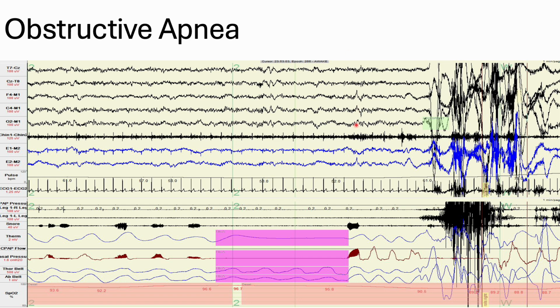I also would have made the arousal more right here because that's when the big breath happens and you have PDR right there. But this was just scored where it kind of looks obvious. The problem with that is not lining up with this, and so this is not being counted towards an obstructive arousal. It's just a spontaneous arousal. So that'll be underscored.